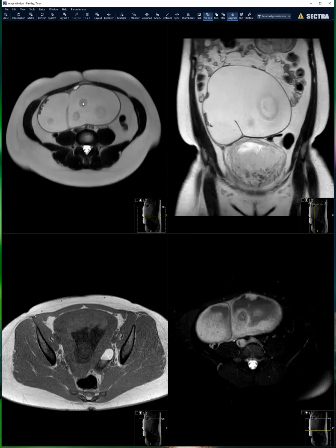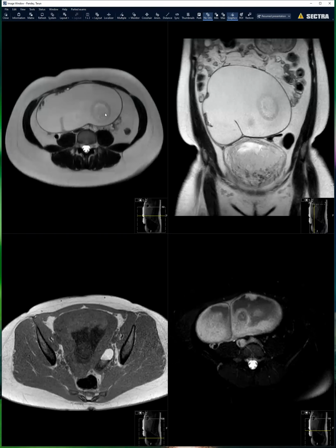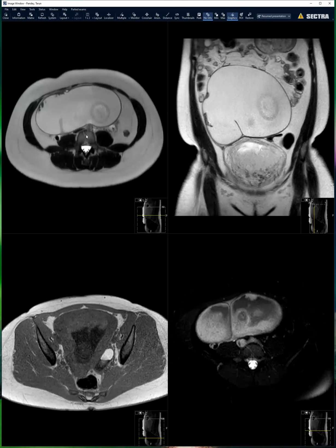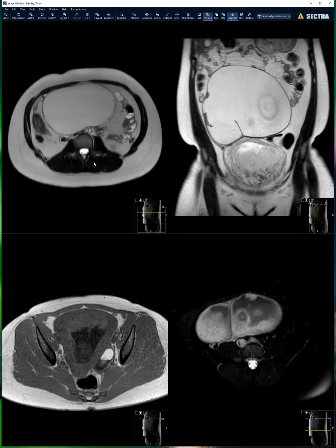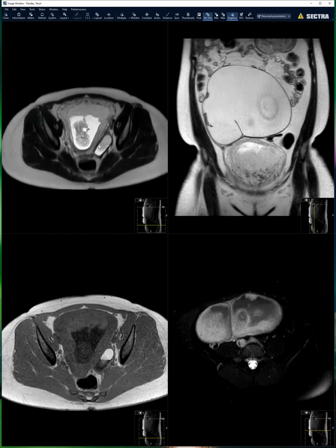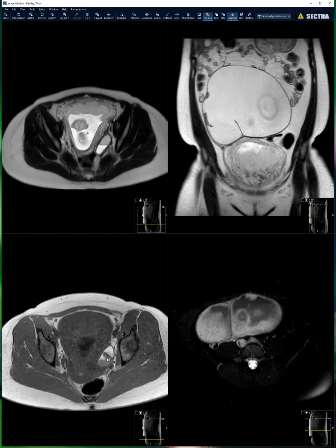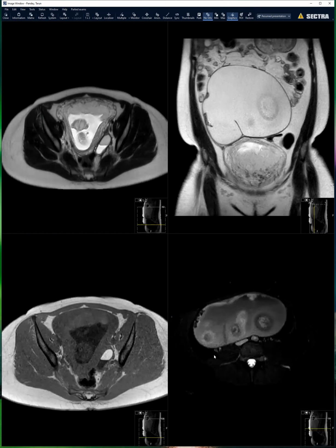these small elements we generally see contained within the dermoid, and they look like they are just freely floating within this. So that's what I was thinking, that maybe it has ruptured, but certainly I was not sure about it. And it looks like there was another dermoid in the making on the other side as well. Looks pretty similar, satting out here. There's a fat fluid level over there.